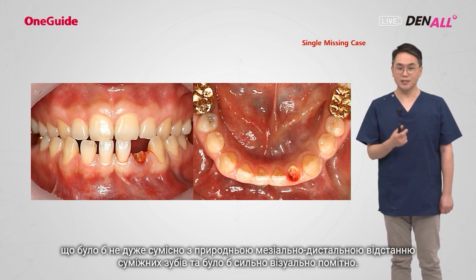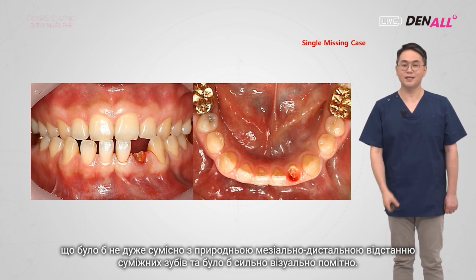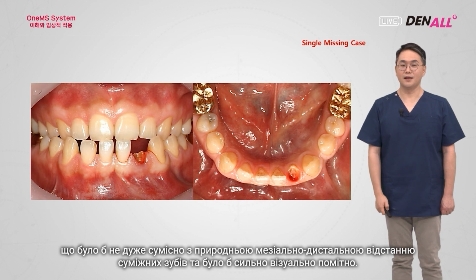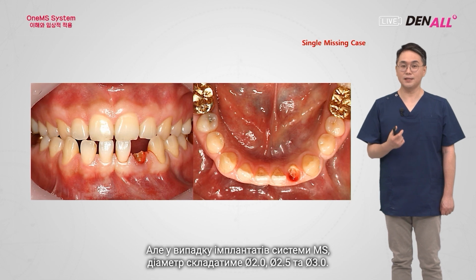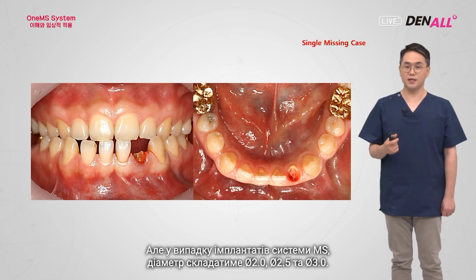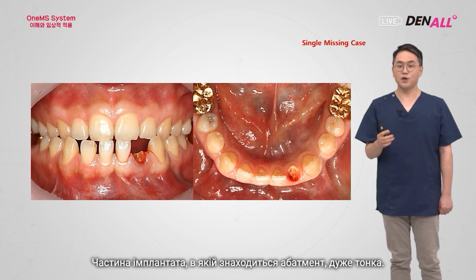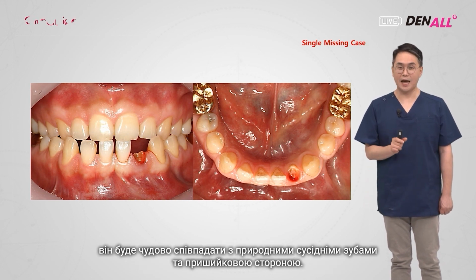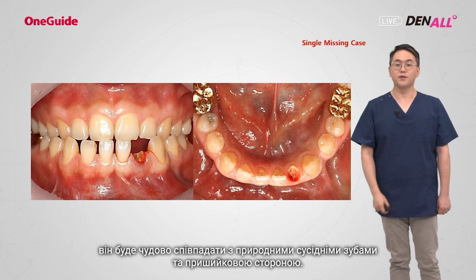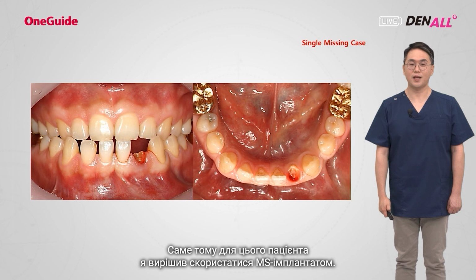For the adjacent natural teeth, with that mesiodistal distance there's not much interproximal space, and it will be very detectable. But the MS implant's diameter is 2.0, 2.5, and 3, so the abutment part is very slim. Hence, after making the final prosthesis, it will match very well with the adjacent natural teeth on the cervical side. That's why for this patient, I went with the MS implant.